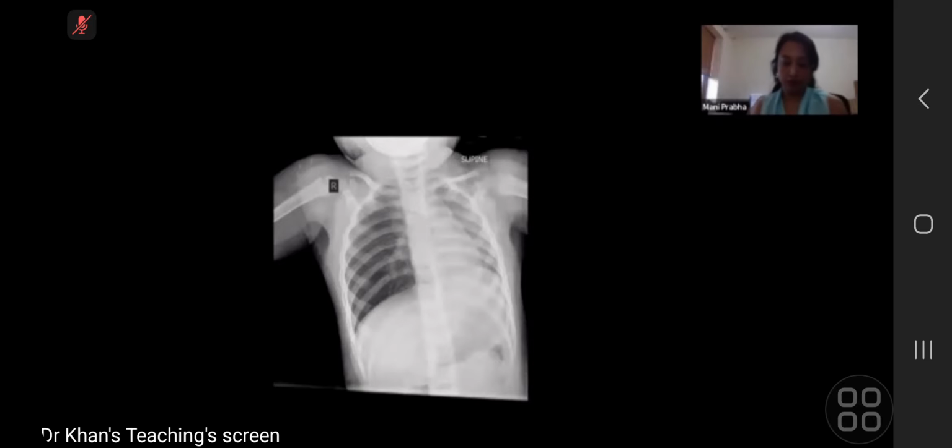Expiratory radiograph. Okay. So the expiratory radiograph demonstrates air trapping in the right hemithorax, which would be in keeping with a foreign body inhalation. There is an impression of an increased opacity projected over the 6th or 7th rib, which may represent a radiodense foreign body.